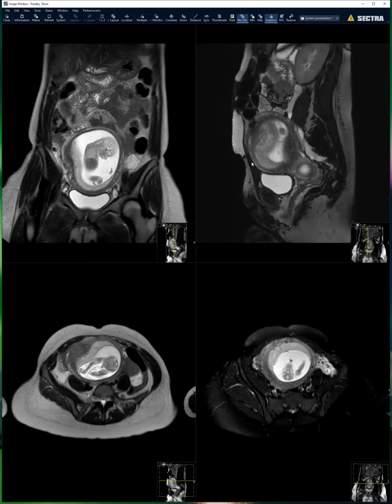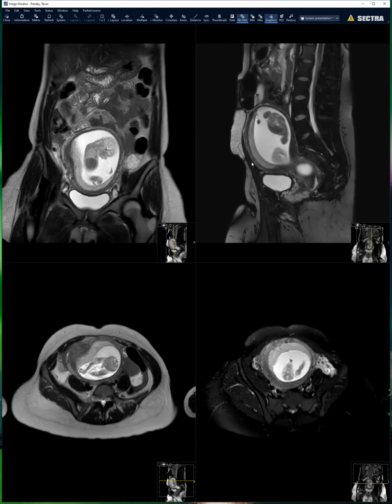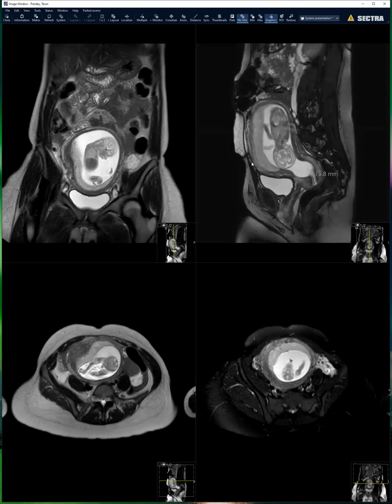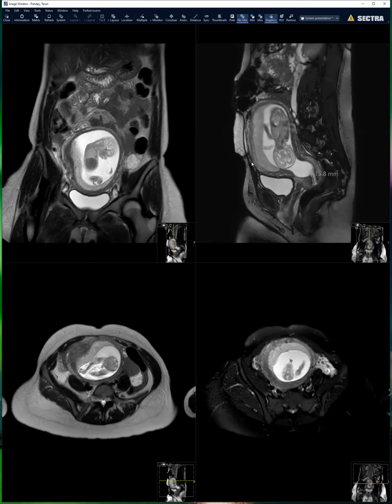Yeah, I'm thinking with the bleeding, it might have already been in progress rather than just cervical incompetence. But yeah, this is really early to have so much cervical incompetence. Yes. And if it's less than 2 centimeters like this, they usually put the patient in Trendelenburg. They're on bed rest. They might do a cerclage. This is pretty early, so the patient would be on bed rest for several months. Right. But yeah, it's a good case.